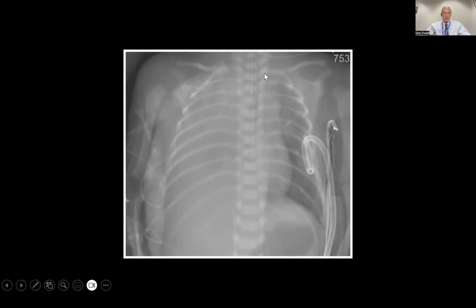what does the heart and the mediastinum do? With collapse, it's going to move towards the area of whiteness. And if it's not collapse, if it's pleural fluid or if it's a pneumonia, it's going to shift things away. And you can see here, there's a slight shift towards the left. So this is parenchymal opacification, maybe some pleural fluid, maybe it's a consolidation of the lung. If you needed to separate those things out, what would you do? Of course, you would get an ultrasound to look for those different things here.